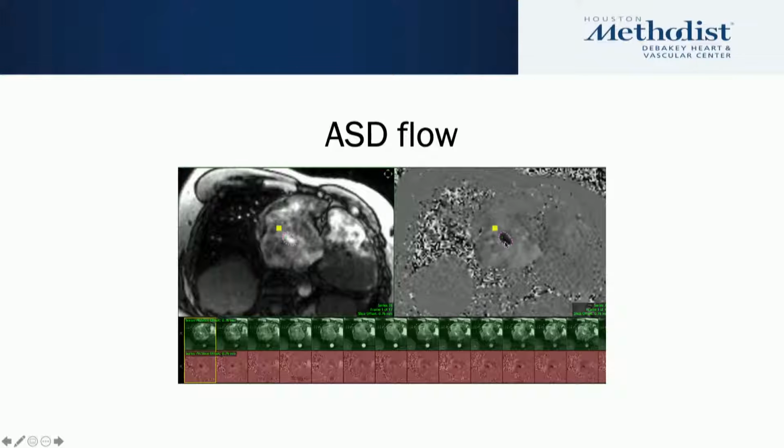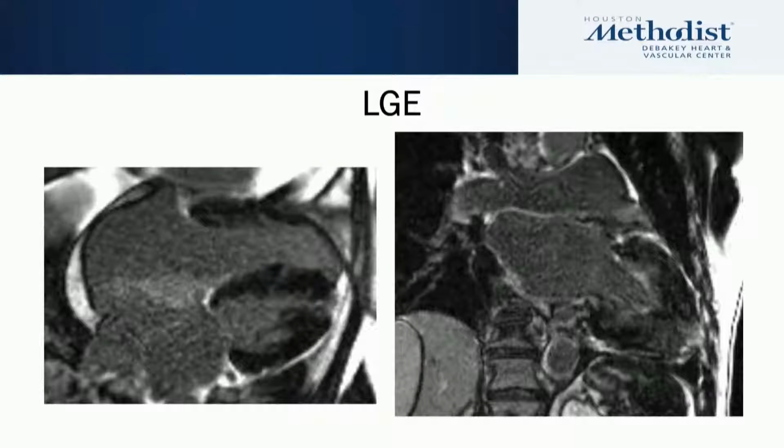We can also measure the ASD. It's one of the ways we can measure the ASD as well. Now, moving on from here, we did assess the aortic forward flow, the PA forward flow. We did assess the MR and the TR.